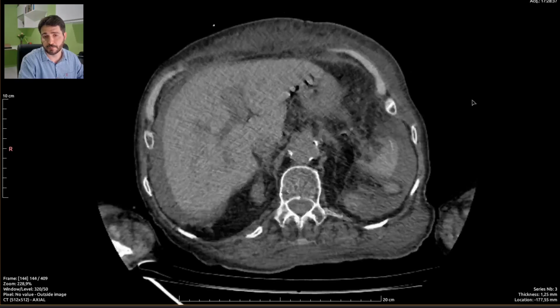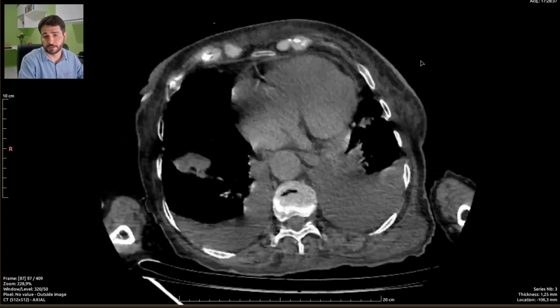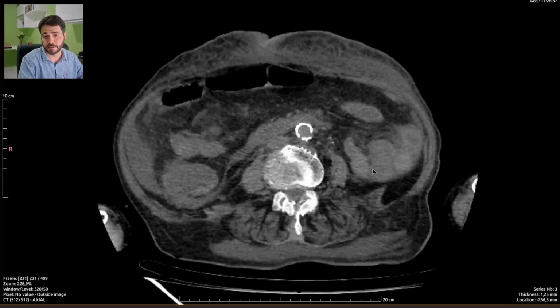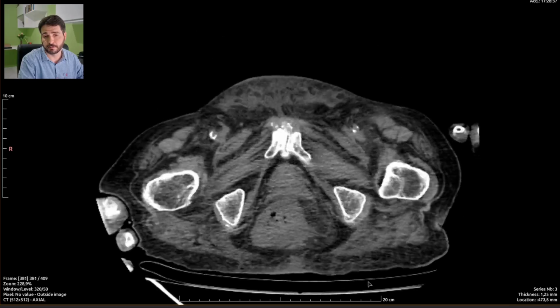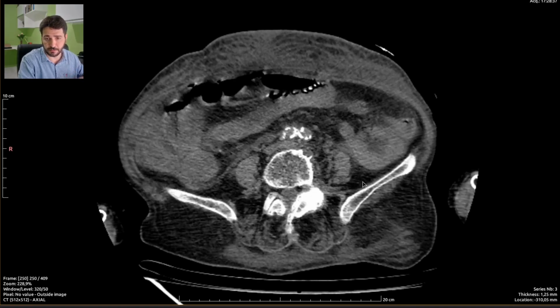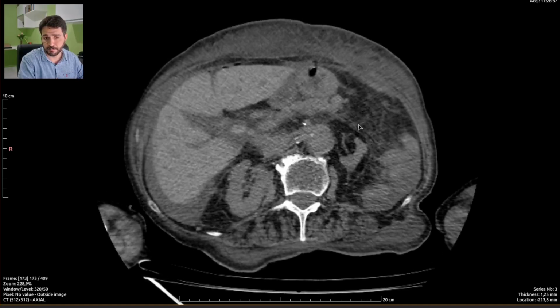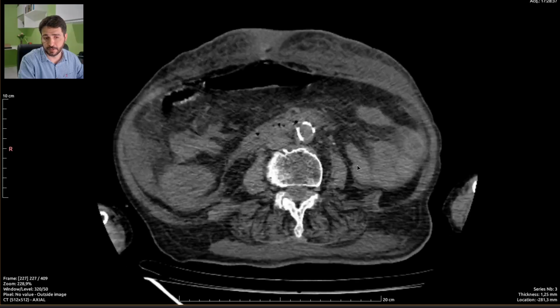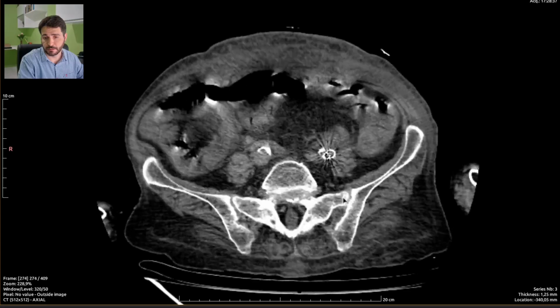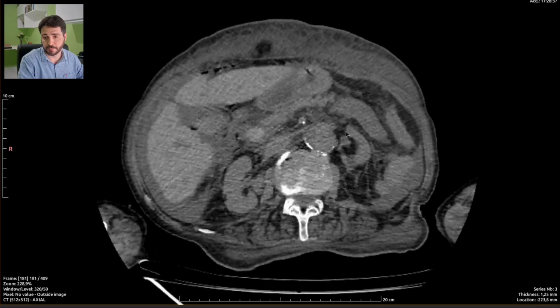It's quite easy to miss something, so we just have to be sure we report the major causes of this acute abdomen, the really important features of this group of diseases all meshed up together, so we can actually help the referring physician make a decision about how to take care of this patient.